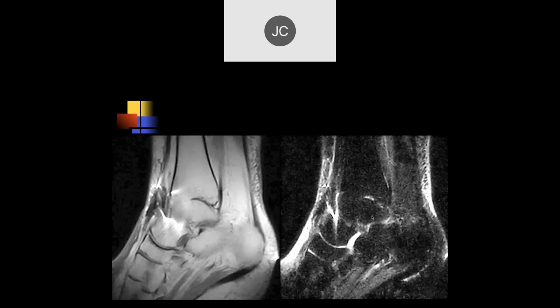Okay, so here looking at the tibio-talar joint, looks like there's bone fusion anteriorly. And posteriorly, I don't see normal cartilage. Looks like there's bone-on-bone contact there. So this is a bone fusion. John, this is fused in flexion.